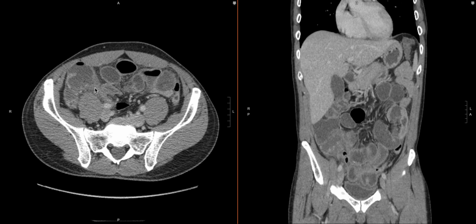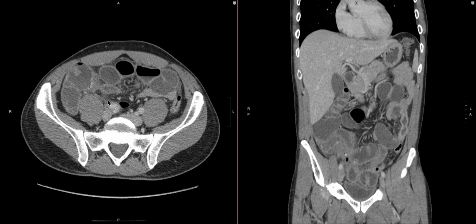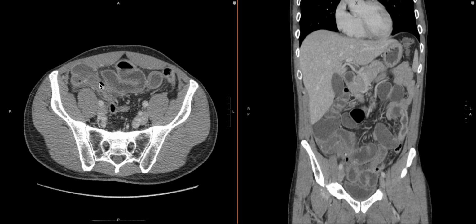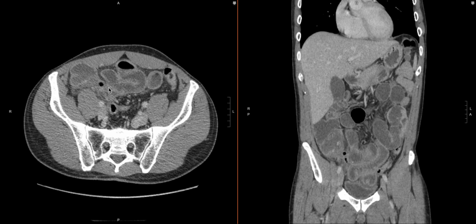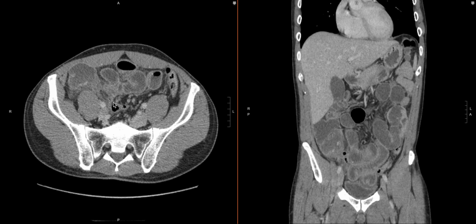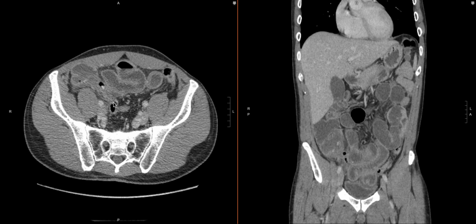And it looks like down here more towards its base, it's very busy, but we seem to have something right here coming off, and then it looks like it loops around and points back from where it once came. And there's actually a little fecalith here, a little bit of air. So this is actually a pretty good look for the appendix, but it's a very peculiar shape where it comes out and loops back around and kind of folds on itself.